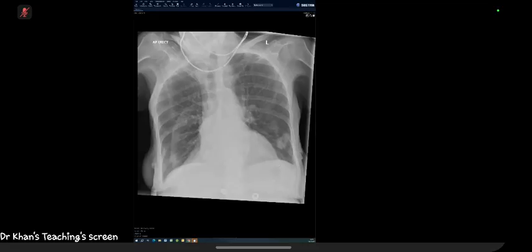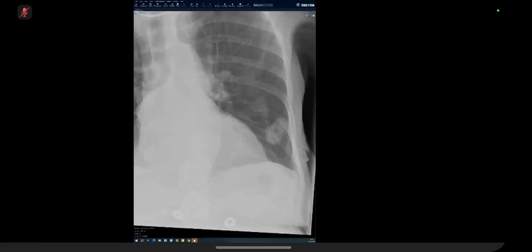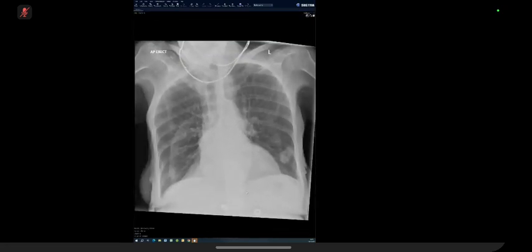Okay, so I'll focus on the left lung opacity. I think there is a lucency within it. I'm trying to look for other. Yeah, there is a lucency within it. I'm looking for other lung opacities at the same time, which I don't see any of. I'm just going to look for any bony disruption, which I don't see any. There are no pleural effusions, and I think below the diaphragm, everything is clear.